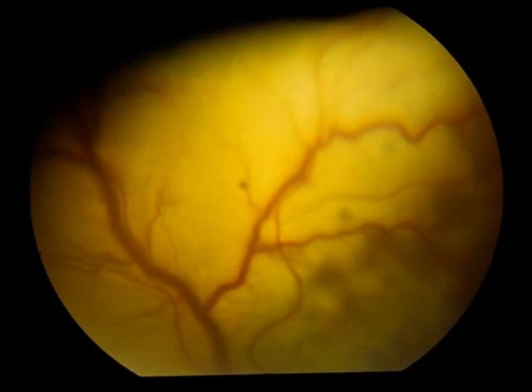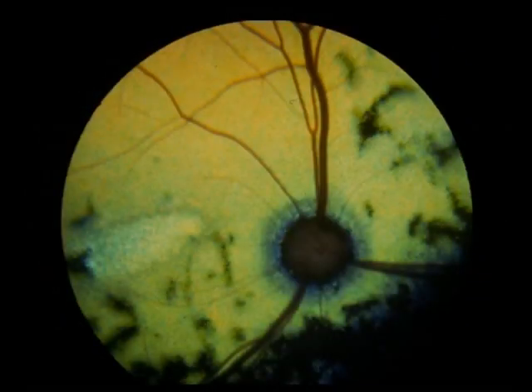These active inflammatory lesions were caused by a fungal infection. Extensive subretinal cellular infiltration has resulted in areas of focal retinal detachment. Again, note the ill-defined borders. Inactive inflammatory lesions are generally more clearly defined.